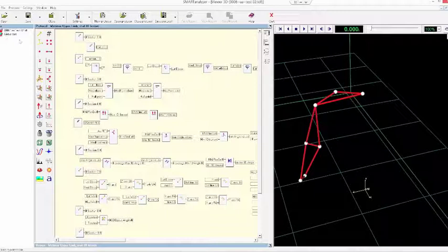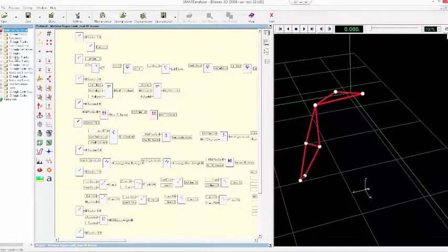And the data panel on the left contains the TDF file containing all the tracked trajectories and all the variables that we have computed with the protocol blocks that we have applied to the trials. The global data folder contains the computed average variables in case we apply more than one trial to the protocol. Well, let's now start learning how to create a new report.